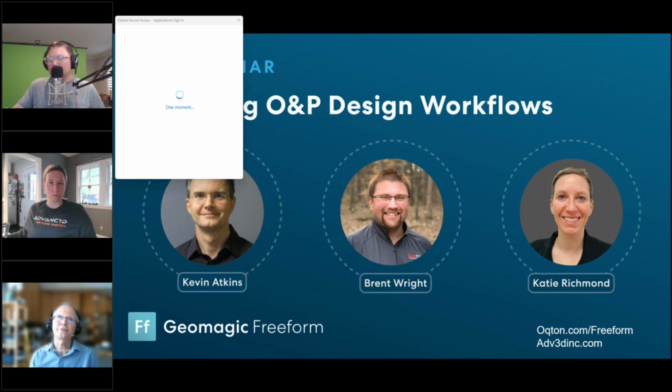But for PDF, if you have like explicit curves in PDF to get them in, I'd have to double check that. Okay, cool. But there's a lot of great ways to use images as references in Freeform, and so I think that's a great thing to do, and more people should do that.